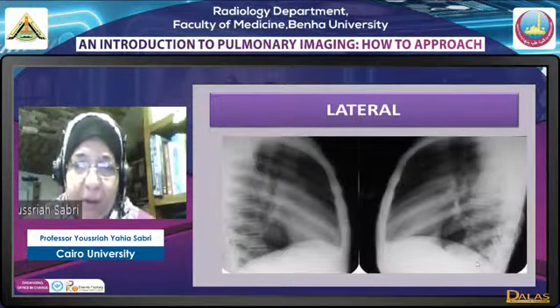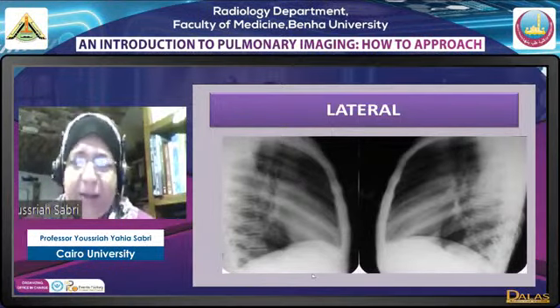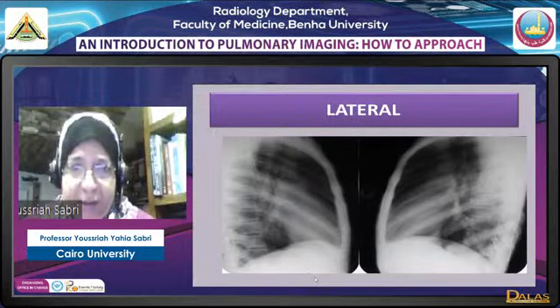بشوف مين فيهم أعلى ورا. هنا الليفت أعلى ورا يبقى ده left lateral، هنا الرايت أعلى ورا this is the right lateral cupula. This is the easiest way to identify which lateral is this.